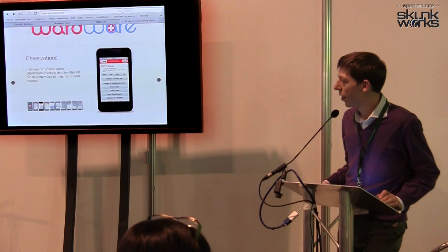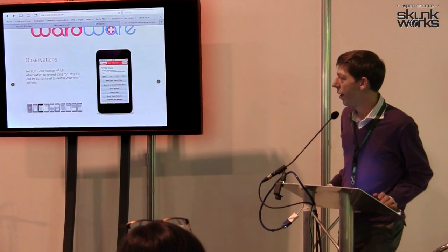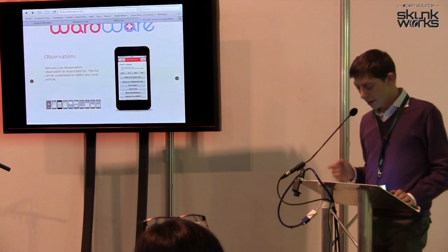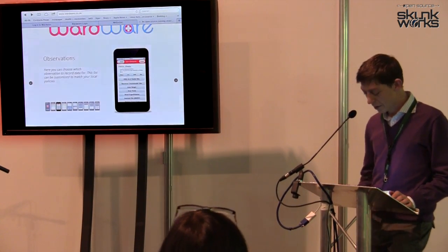And we can see here that we've got a number of obs that we can do. We can start with the standard early warning score observations. We also are able to do fluid balance, blood sugar, Glasgow coma scores, and other scoring systems that I'll show you in a bit more detail next.